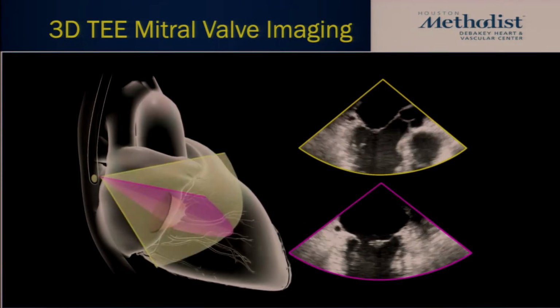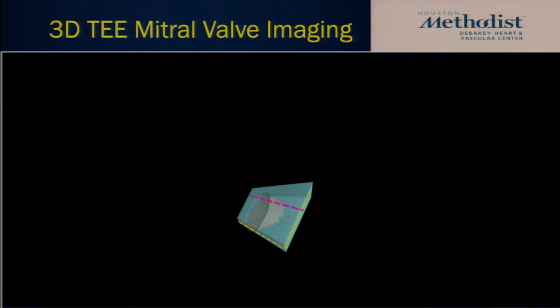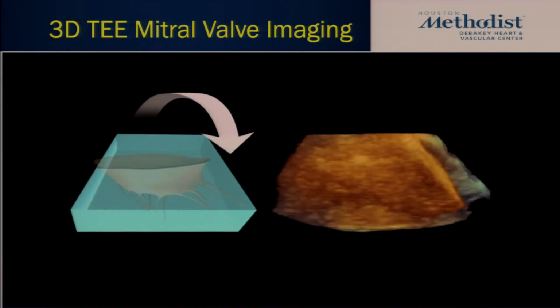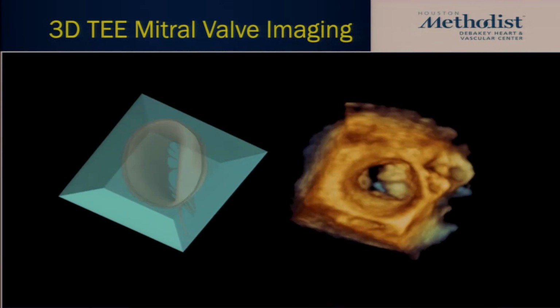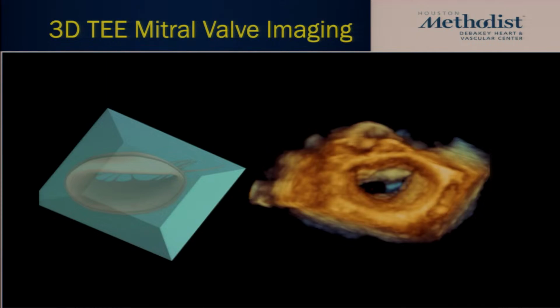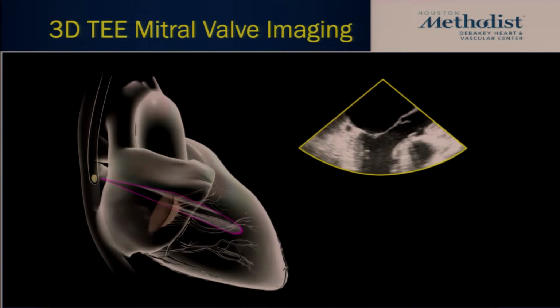So this is how we set up a view, two orthogonal long axes. Typically the mitral valve is a very nice example of the blue box of the pre-cropped volume. This is the tricky part. You get this volume, it's displayed to you like this, and then you have to manipulate it, typically with the wheel. So you tip it forward to look down on it, and then historically you could either back rotate or somehow rotate to put the aortic valve at the top to give you a standard view. That's kind of the challenge: you get the volume blob, then you have to know what to do with it. We try to teach mastery of the trackball, and that the Z-rotate is a sign of weakness.